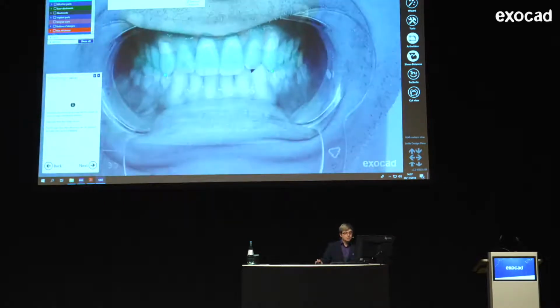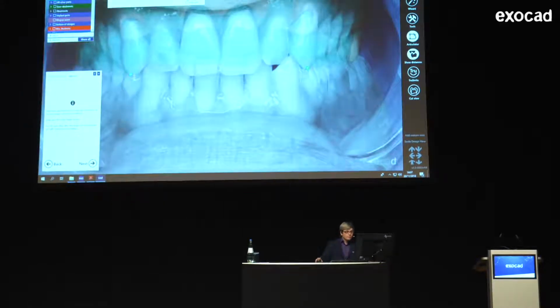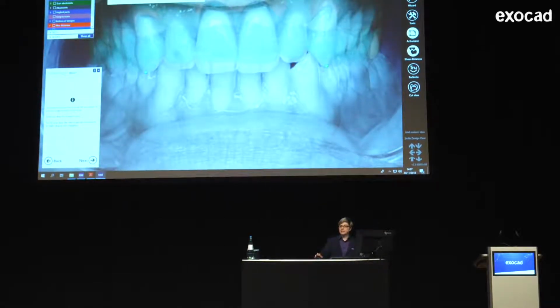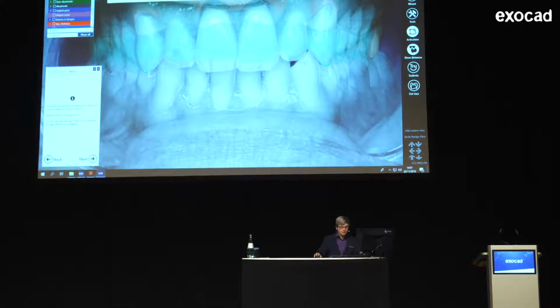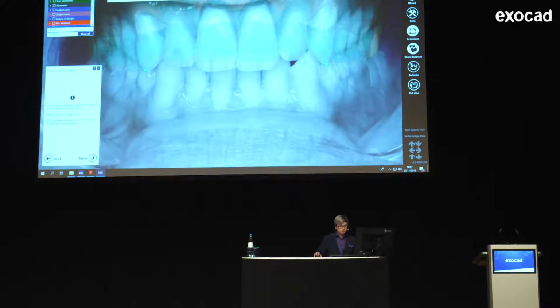And now you see the overlay, the model behind the grayed out picture. It's a bit hard to see. You have to learn to get a view for that, actually. But after 2 or 3 times, I think everybody really gets it. You see the grayed out image moving when I move those points around. And I'm just trying to place them in a way that both of the canines are perfectly overlapping.